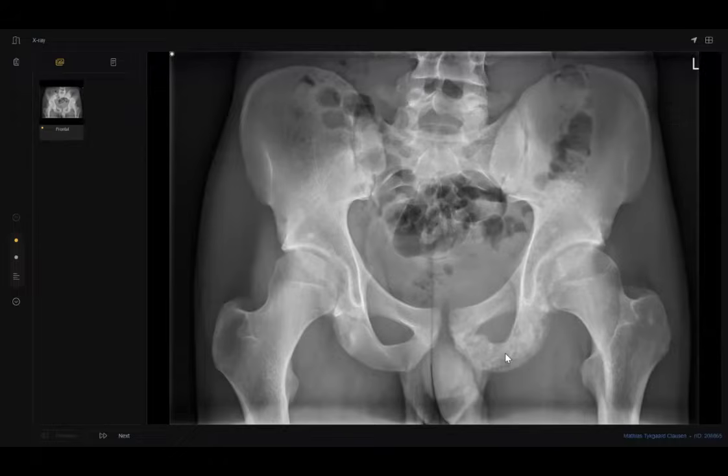This is the moth-eaten appearance. The name refers to an insect that eats our clothes, because it causes the same appearance. Not a big deal whether you describe it as permeative or moth-eaten.